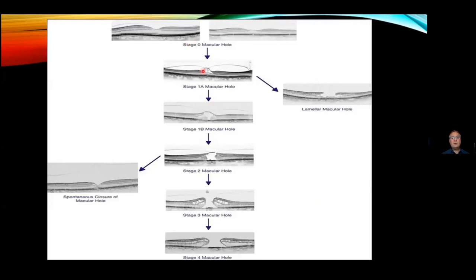And this is how the macular hole will evolve. So that is a normal OCT with the vitreous still attached to it. It doesn't seem to have any effect on the foveal pit there. That is, like I said to you earlier, that we see often the vitreous just starting to pull on the foveal pit there, but not having any effect on the outer part of the retina.